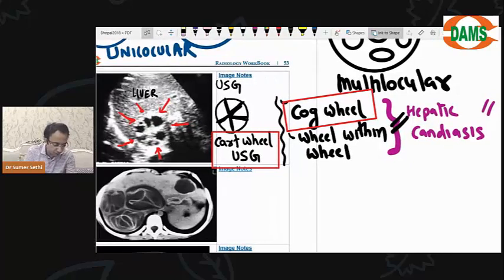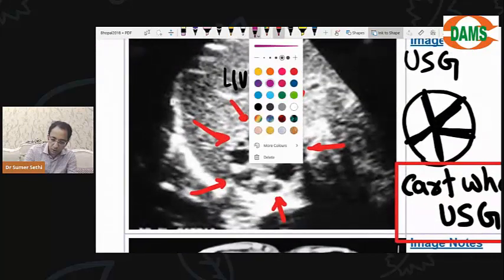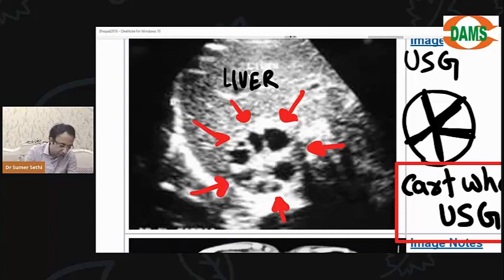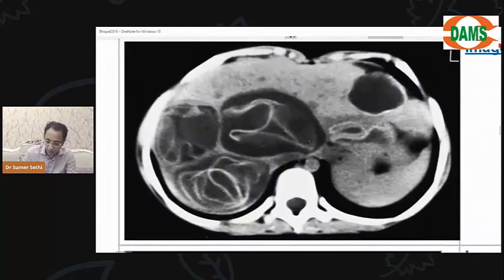I can see some of you are able to answer it correctly. Very smart. It's such a pleasure to teach such intelligent students as you are. It has been my pleasure to teach all of you. It is very interesting all the time to have constant feedback from you whenever you are answering. So let's see the next picture.